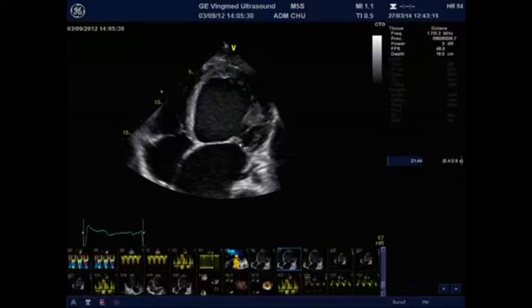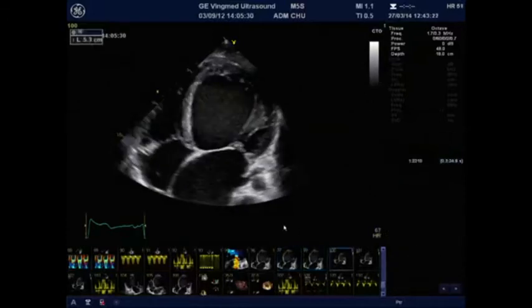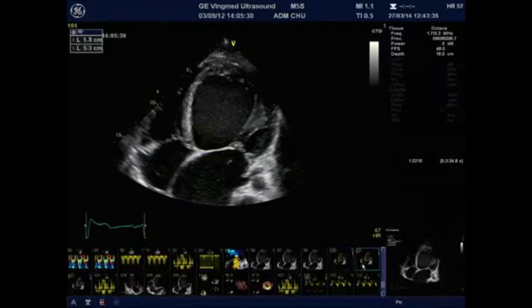It's a mixed pattern that could be seen in these patients with severe enlarged left ventricle. So what we should measure first is the diameter here. We measure it in mid-systole, often in this kind of patients, even if we can measure early diastole or late systole, but recommendation just say that we need to measure this in mid-systole. And you have to measure the distance between these lines traced here and the coaptation point. This is the coaptation distance.